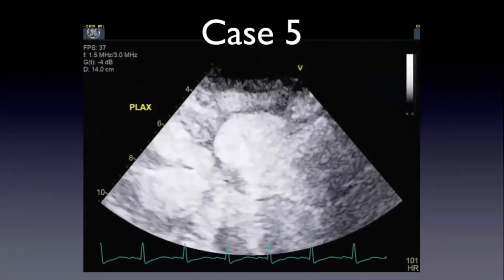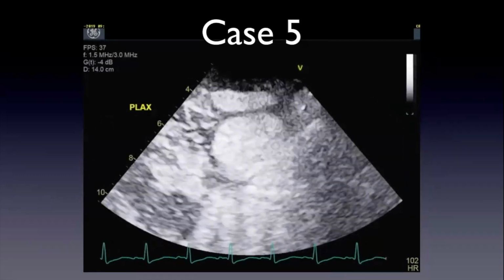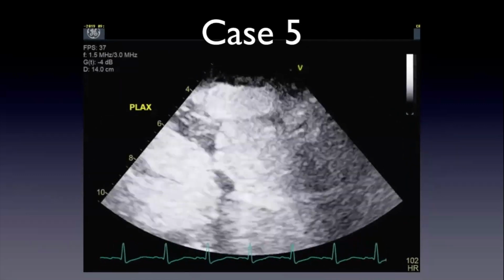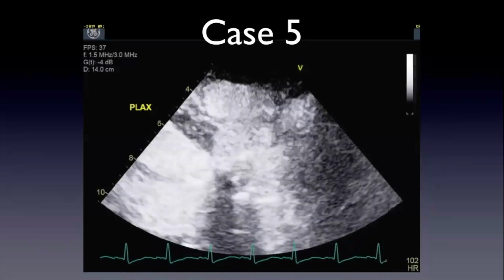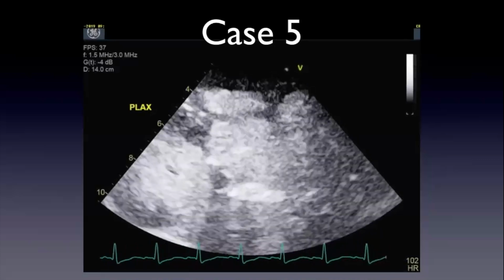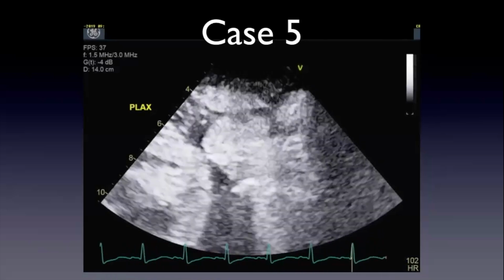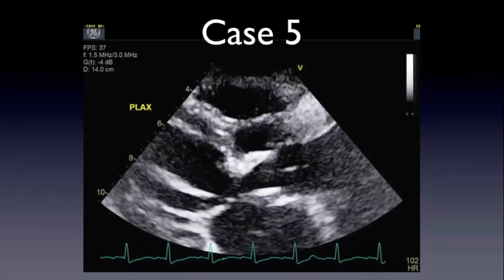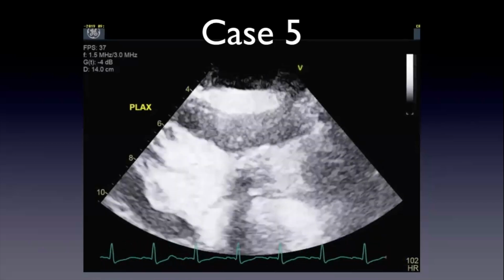Okay, let's look at that again. And then now you can pay attention to the timing. So this cavity is definitely connected to the blood. Sorry, it's a very long loop. And at the very beginning, there's attenuation of the ultrasound beam, and then as concentration falls, it clears.